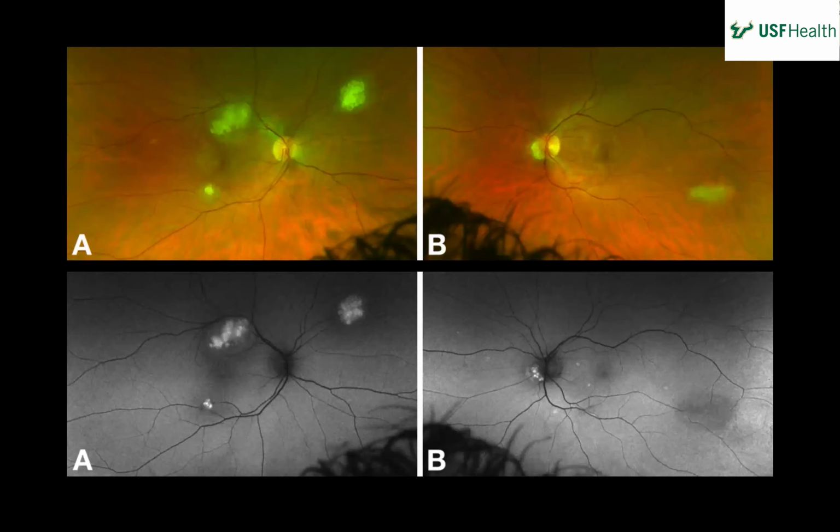In terms of pictures, I just got these off of EyeWiki. For the color photos of type 1, similar to the one our gentleman had, look at the left eye in that inferotemporal area. It's smooth, no calcification, semi-translucent, as opposed to all of the other ones in both eyes, which are that more nodular mulberry picture that we've seen more.